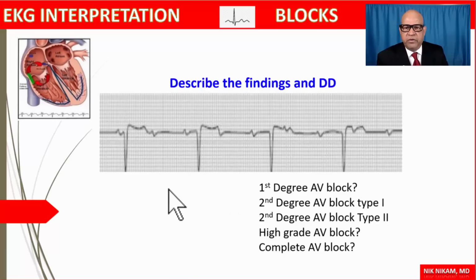Now let's get to the atrial activity. Here, the most important thing we want to do is get the atrial rate to start with, and then see if the atrial contractions match with the ventricular contractions. If they don't, look for AV dissociation. And if you see AV dissociation and if none of these P waves are conducted, then we could be dealing with a complete heart block.